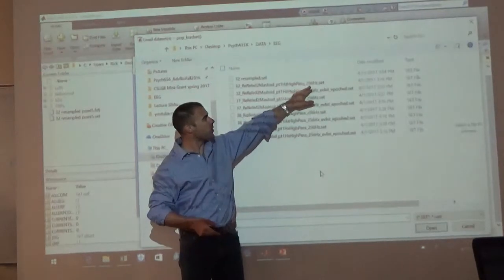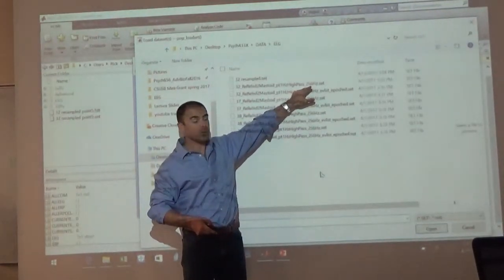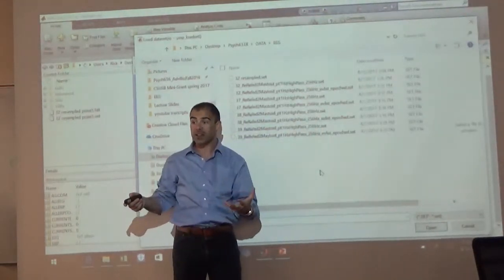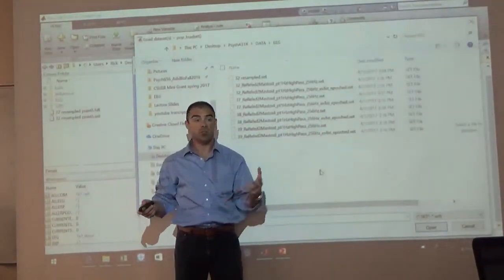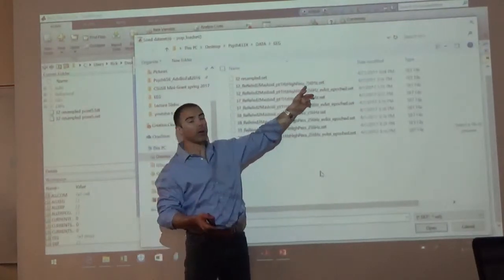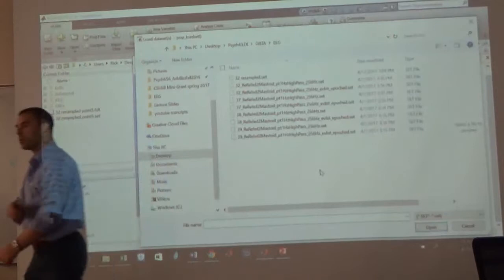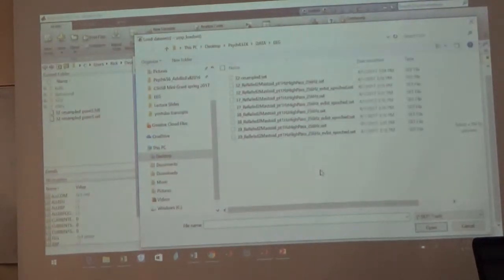The next thing that was done is we downsampled the data. So this is at 256 hertz. You guys remember we did that last class? So all that's been done already in this file, and so now we can just open it for you. Okay, so why don't we grab that file and open it.